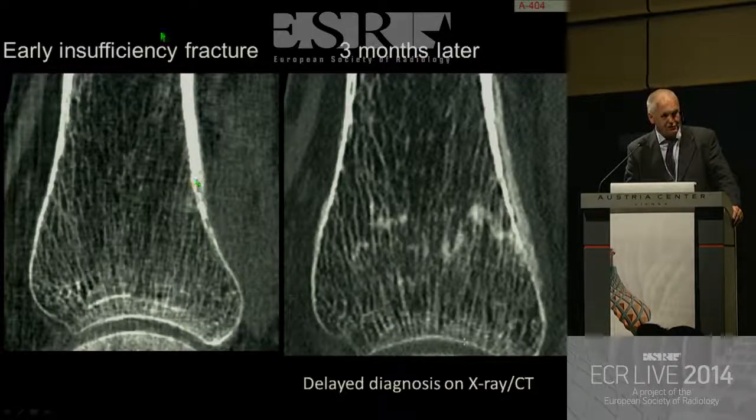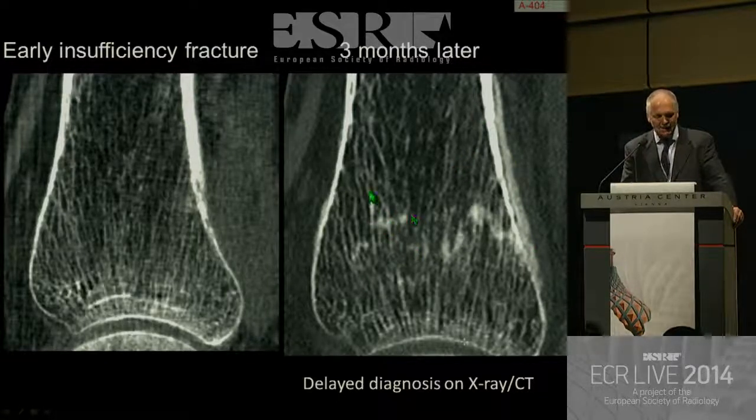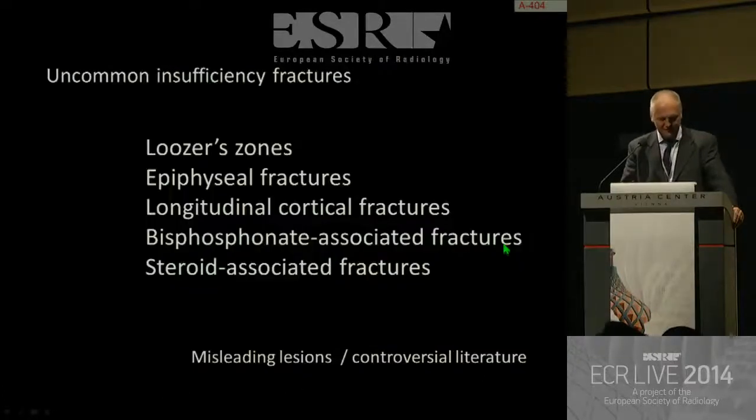A fracture, early CT, nothing to be seen. Three months later, the patient is doing well, a lot of periosteal reaction. Look at these nodules hanging on the weight-bearing trabeculae. These are the fracture, and the fracture line aligns on a line which is suggestive of an impaction fracture.